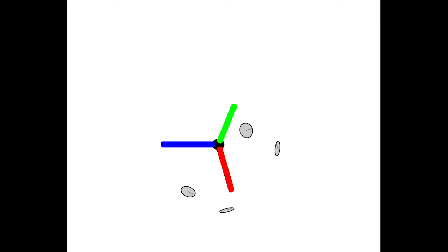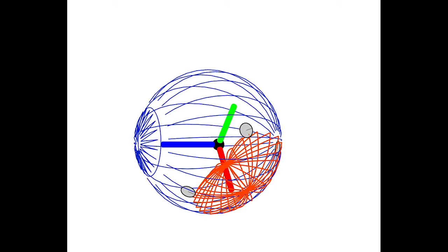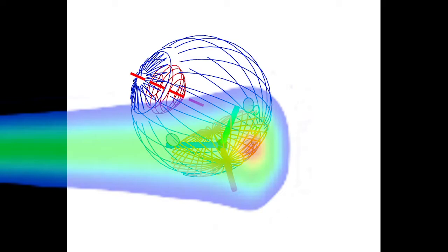The treatment planning system iPlan builds a geometrical eye model that includes tumor, eye globe, lens and other notable ocular structures upon the clip's configuration measured at time of simulation. Then treatment planning is done. This procedure consists in finding the best geometrical configuration, in terms of gaze direction, to achieve complete tumor coverage and optimal radiation sparing of the surrounding healthy tissues.